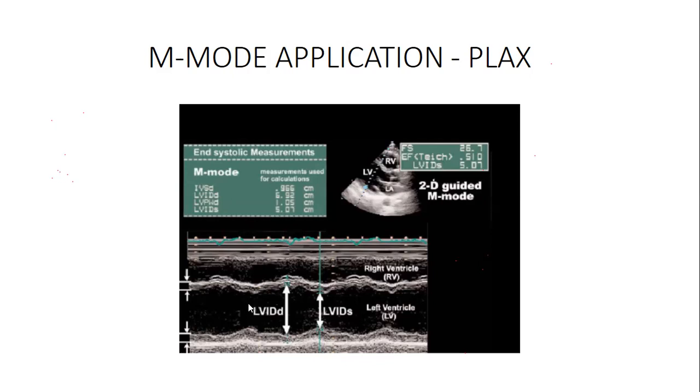So when you look at these figures, these abbreviations they have put, this is left ventricular internal diameter in diastole. This is what I'm explaining. The heart muscles there relaxed. Now, this is left ventricular internal diameter in systole.